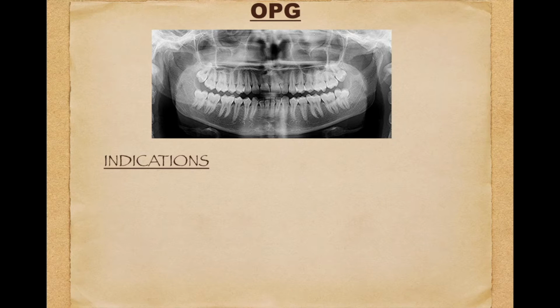In this video, I am going to discuss the anatomical landmarks on OPG. Before going to that section, let's discuss the indications, advantages and disadvantages in short. OPG or orthopantomogram is used to evaluate the complete dentition.